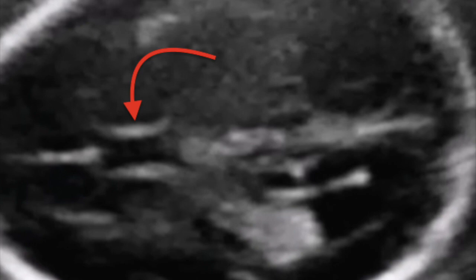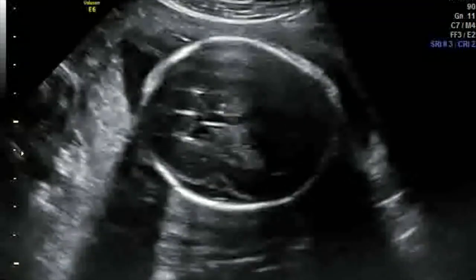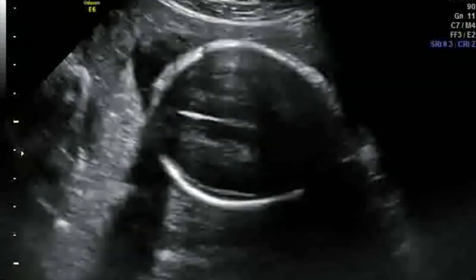This is the typical Cavum Septum Pellucidum, which has a rectangle or a rhomboid kind of shape. As you can see, it is a clear space, there is nothing in between, and this is a clear space with the rectangle shape. That is the normal appearance of a Cavum Septum Pellucidum.